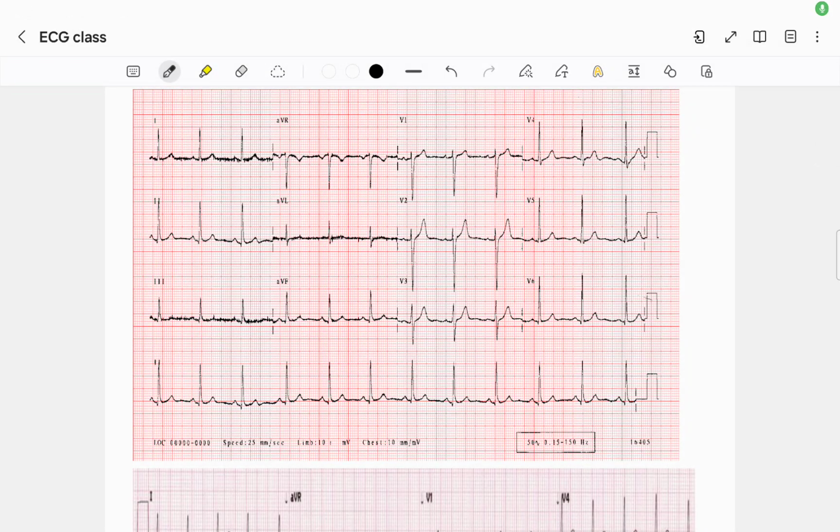So, welcome to our final video on introduction to reading the ECG. What we're going to do in this video is read a few ECGs and talk a little bit about what's normal and variations of normal. We're going to be using some of the techniques that we spoke about already.